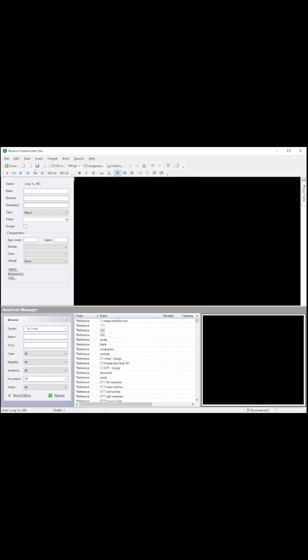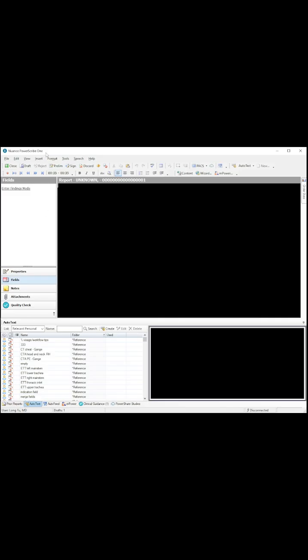That would have been another approach to creating the shorter macro as well, but this is how we did the full template. And so the whole macro that, and then just directly through the auto text editor, which is accessible at any time from insert, auto text, create.